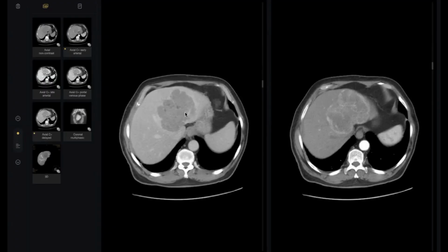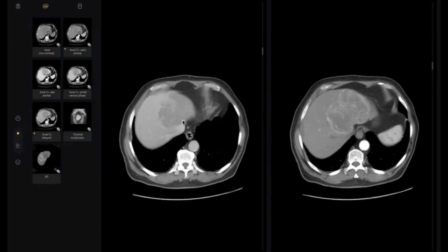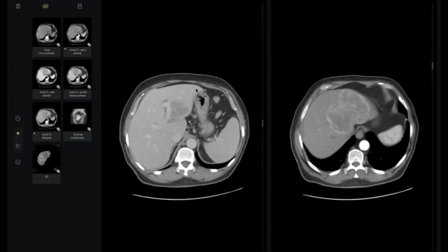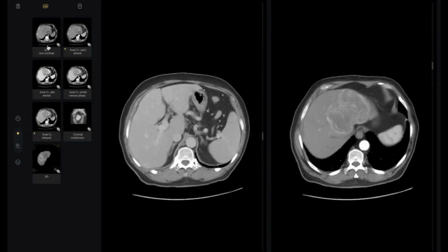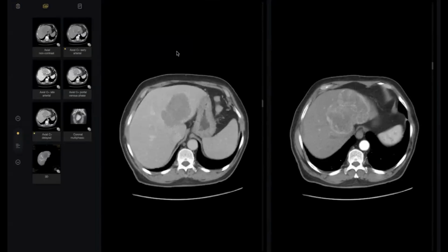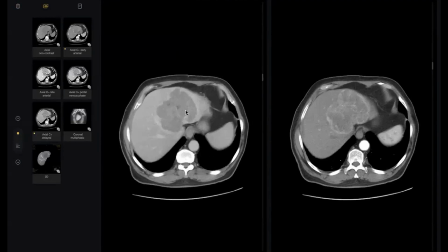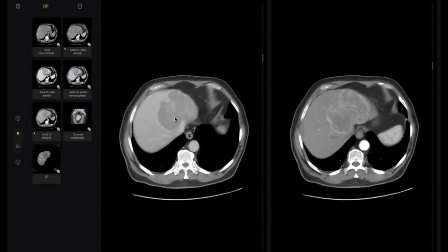Why? Because there are very definite criteria for malignancy, especially HCC, and for hemangioma. Okay, my colleague, maybe the examiner asks you, is this for biopsy? Don't refuse. Why? Because the patient here is not cirrhotic and we don't have any history of HBV. So, in my opinion, the next step must be biopsy to diagnose, because the lesion has a large necrotic center and it is characteristic of other malignancy.